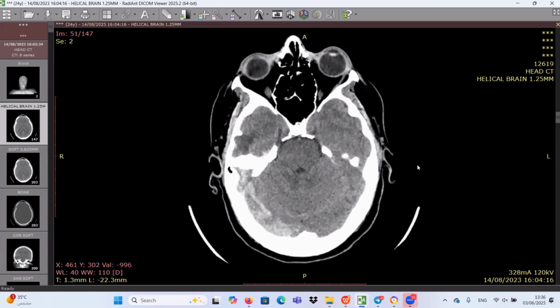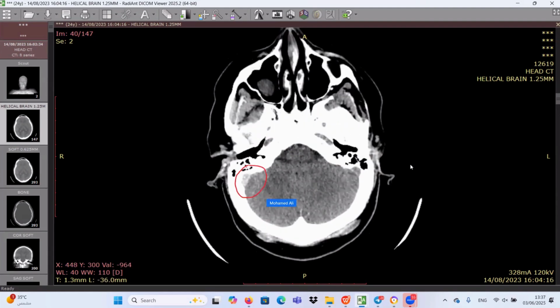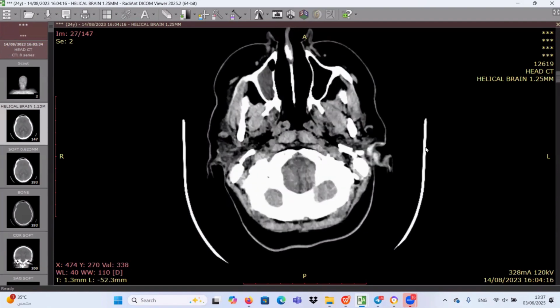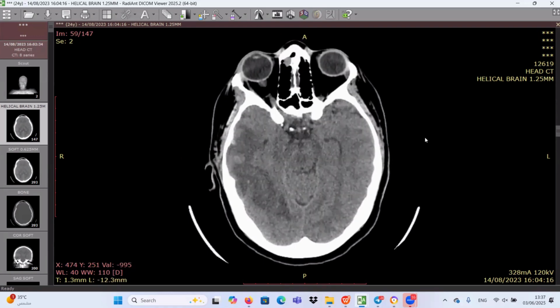Yes. Let's conclude what you say. We have a distended, dense transverse sinus. And we also have the sigmoid sinus dense, and I think we also have the internal jugular vein itself dense as compared to the left side. Okay, yes. So I'm dealing with dural venous sinus thrombosis with a possibility of associated venous infarct on the right side.